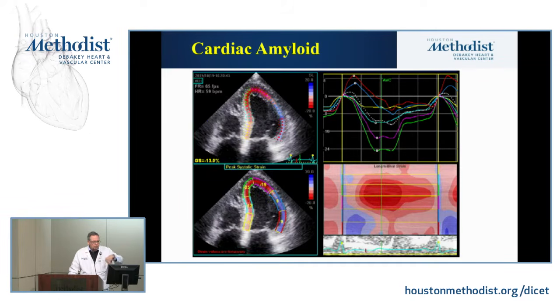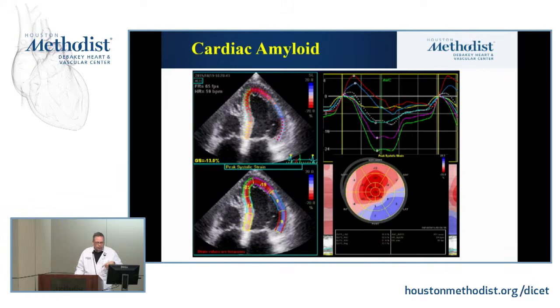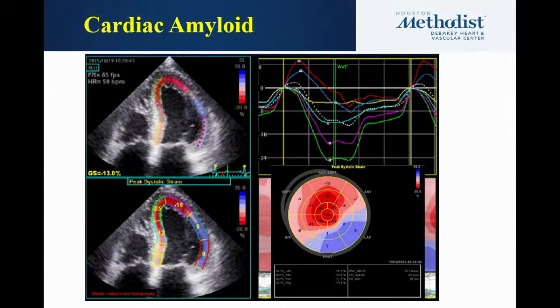Now, something more recent that has come up is that even in the 2D echo, just looking at them, you frequently see a little better wall motion in the apical regions than the base, and when you do speckle tracking, that shows up as the so-called apical sparing. Nice, you see it, you can write it in your report, you have one more piece of evidence to say, so yes, amyloid, but don't hang your hat on that one.